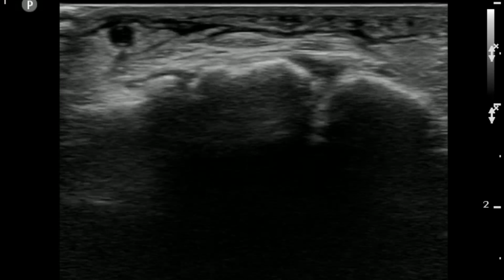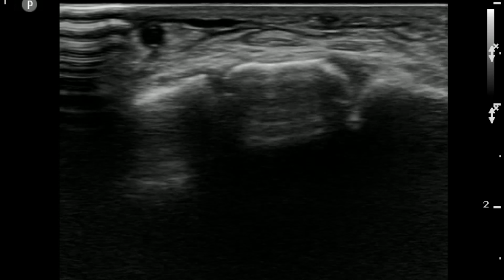anatomy. With that said, what I'd like to do for the duration of our time here is talk about abscess, right? And show some images of the abscess and how you break down the anatomy of an abscess and show the difference between abscess and cellulitis, so that when we go back to the bedside, we can really use this as a tool to help us identify which one's going on, right?